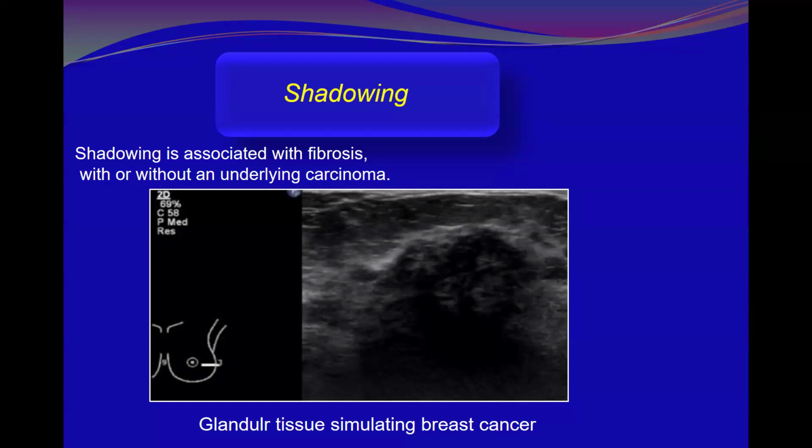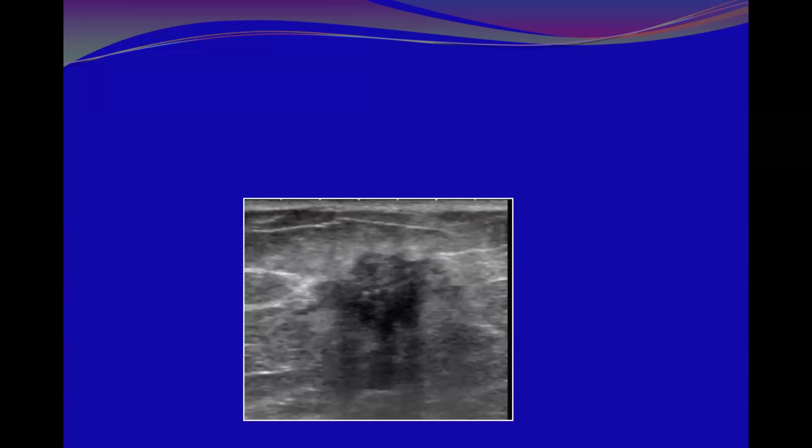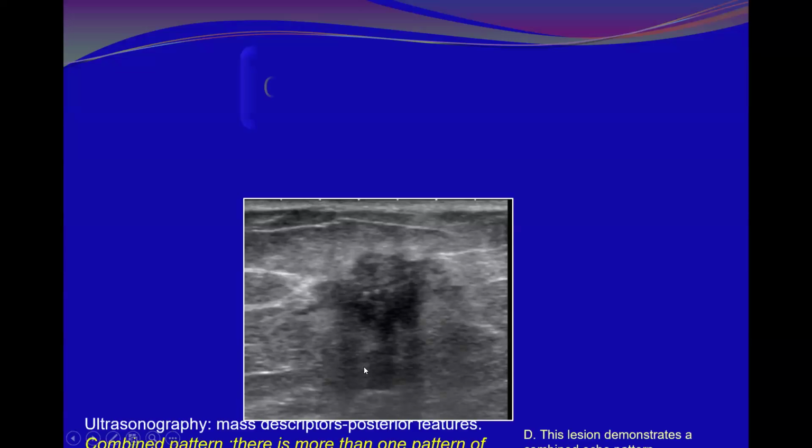So it will affect the sensitivity of the ultrasound study and evaluation, but being bilateral, involving the whole parenchyma, it is not going with focal disease. If we look at this one, I can see some shadow area demonstrating shadowing, while the other one is not affected.